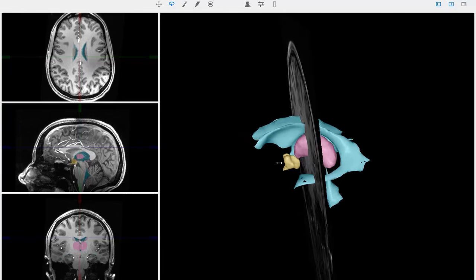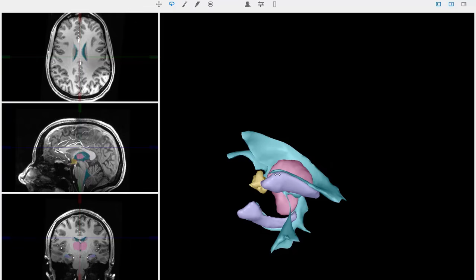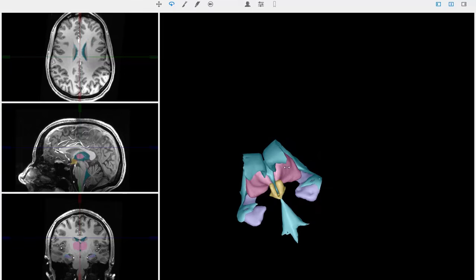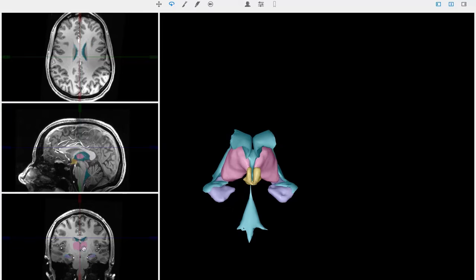Now, two other structures I want to point out at this point here are the hippocampus, which is the gateway for the formation of memories. This is an important part of the Papez circuit. And you can see how the hippocampus is on the medial and inferior edge of the inferior horn of the lateral ventricles. It's sort of being cupped, as if this were a hand, and it's being cupped by that. So it's shown here in purple. So we don't store memories in the hippocampus, but memories must go into the hippocampus before they form circuits through the hippocampus before they can be consolidated into long term. You can see here.